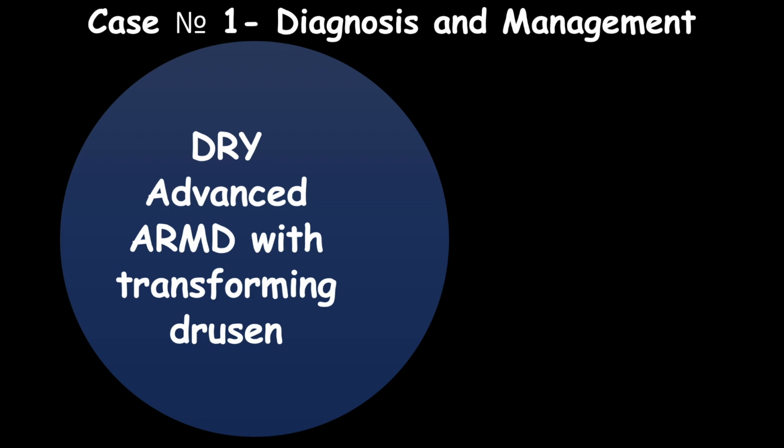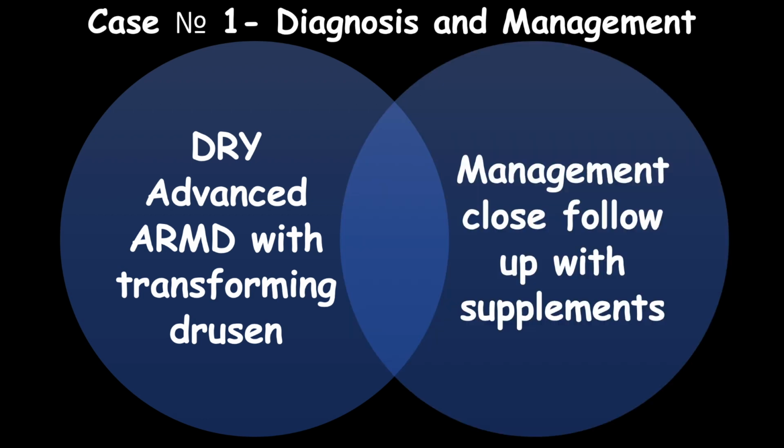The diagnosis is transforming drusen in the setting of dry AMD. Management is close follow-up with oral supplements.